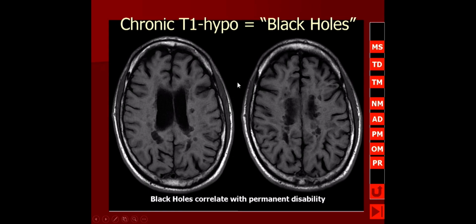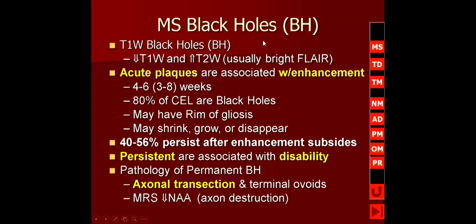So this directly correlates with the patient's permanent disability in patients who have severe, long-standing multiple sclerosis. So again, this is something that we talk about all the time, black holes.